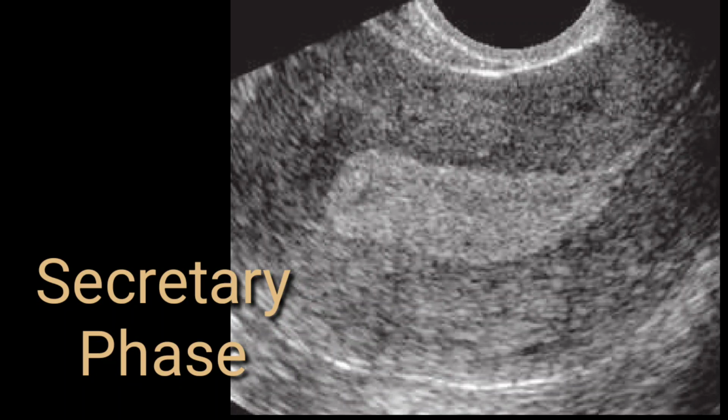We will discuss the endometrial pathologies in later videos, but as far as this video is concerned, it is purely based on the normal or radiological anatomy of the pelvic organs, especially the uterus. So I'm not going to discuss the pathologies of the endometrium here. So this image shows late secretory phase of the endometrium. So mention this in the report and confidently give your conclusion that this endometrium is in secretory phase.